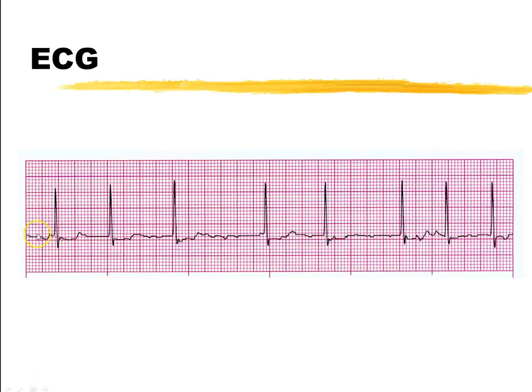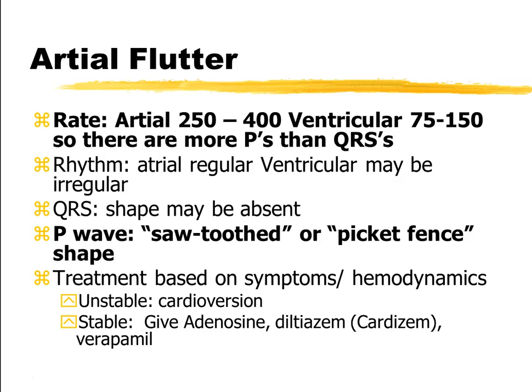And let's go to the P wave. Can I see one? Well, is that a P wave or a T? I don't know. You can't tell, especially what's happening right here. I can't tell what's happening there. Maybe that could be a T wave, or maybe it's sort of a P. But consistently, you just don't see it happening. So there's no real discernible P wave consistently throughout this. And couple that with the irregular rate, we have AFib right there.